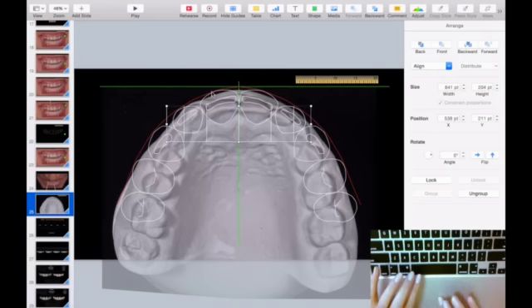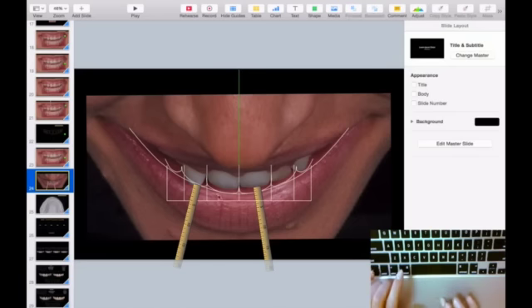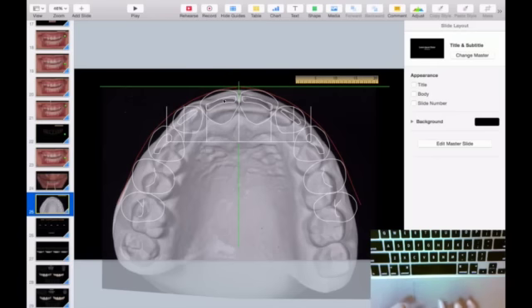And now you can position the teeth. You know from the 12 o'clock picture that you can add volume here. You have to take a little from this. This canine is correct. So you have these 3 teeth that need volume. These 3.